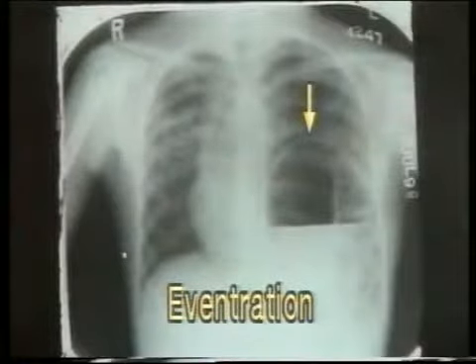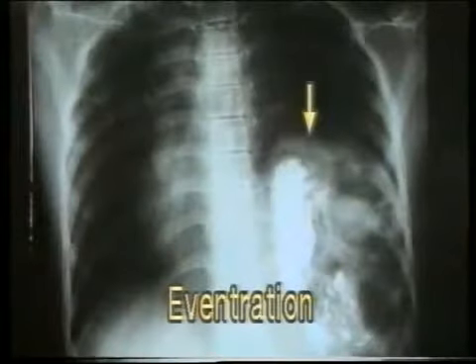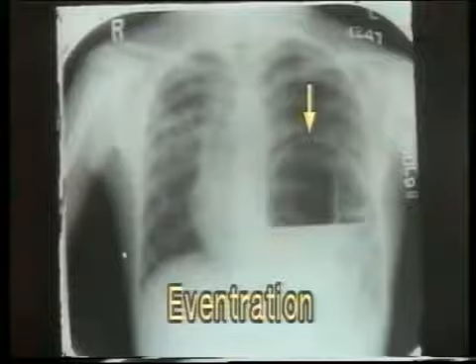This adult patient has developed tuberculous infiltration in his right lung, and the eventration of the left diaphragm was an incidental finding which was initially mistaken for a lung abscess. Barium meal shows the stomach and intestines in the chest, confirming the diagnosis of eventration. Note the smoothness of the dome of the elevated diaphragm and the gas shadows and the fluid levels.